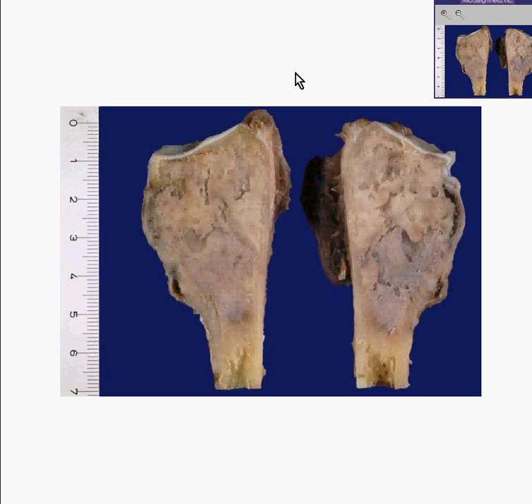Often in pathology, the x-ray is regarded as the gross specimen for bone disorders and bone tumors. In this case, we also have the advantage of the actual gross bone specimen that we just saw. Notice how the articular cartilage is spared, and the distal cortex is also spared, but the tumor, which arises in the distal shaft, has completely gone through the growth plate.